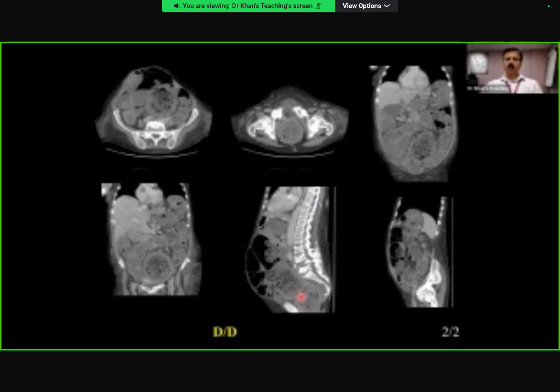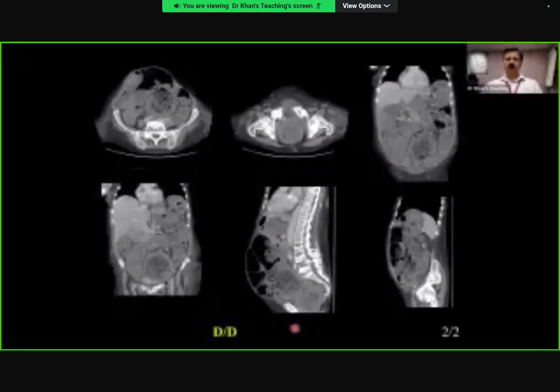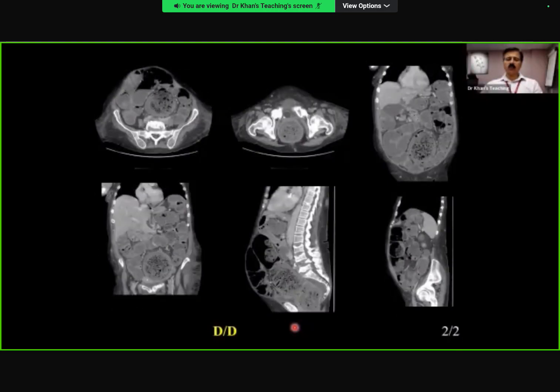This is a case of pseudo-obstruction, chronic pseudo-obstruction. And pseudo-obstruction, as I told you before, we'll see in bed-bound hospice cases, things like that. Because of chronic constipation, they are like this. If you compare it with the previous film, it will also be like this. And every 3-4 months, they might be coming to your A and E. In these, the criteria for dilatation is different, as I told you in the table. Up to 22 centimeters has been documented.